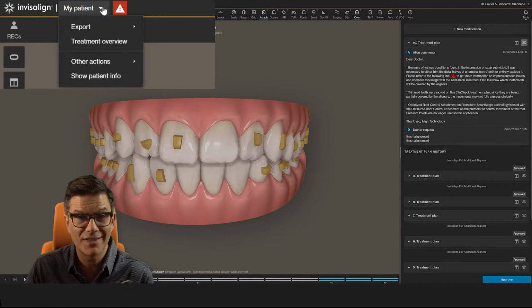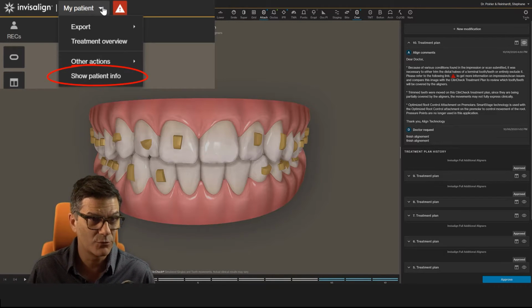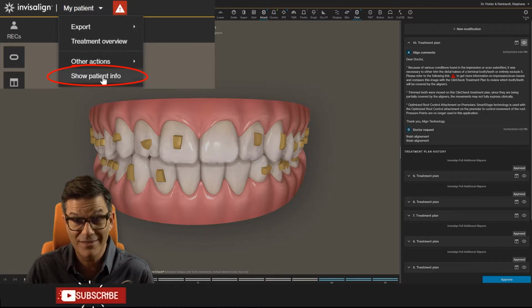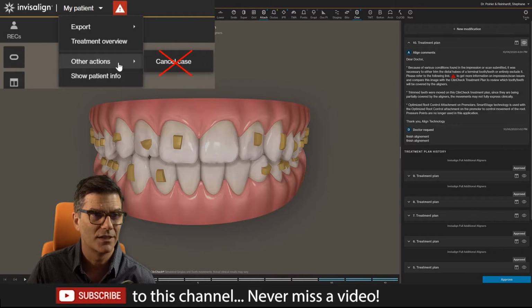Now I removed the name of the patient for the video, but let's say you want to share, you can remove the name of the patient. And if you want to show again the patient's info, it's just here. Other actions, cancel case. I don't want to do that.